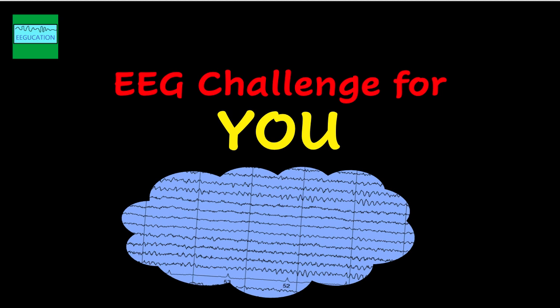We have a very interesting EEG today, and I would want you to try to interpret this EEG and provide a report to the referring physician. What I want you to do is, as we move along, so let's do that right away.